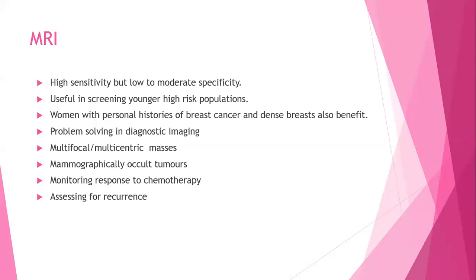Also useful in estimation of tumor size, with detection of the invasive component of ductal carcinoma in situ lesions, and in the presence of malignant axillary nodes with no primary tumor seen in the breast on mammography, it can act as a problem-solving modality. MRI is also useful in assessing for disease recurrence, especially in patients who have had surgery. And we look again at the enhancement of the parenchyma. After 18 months, it is said that we should not really have enhancement. So if a patient has enhancement at a scar site 2 years after the operation, then this is a patient who may need to be biopsied again to see if there is a recurrence.